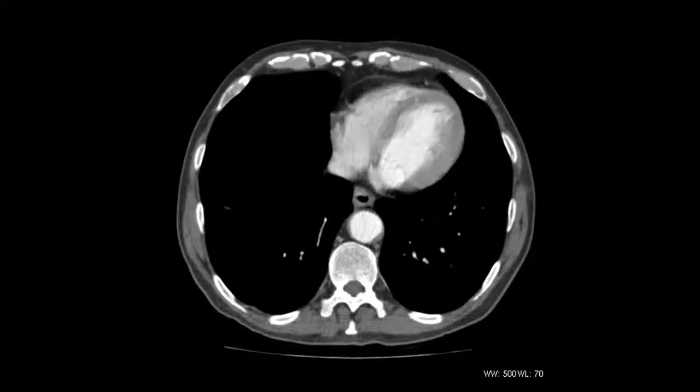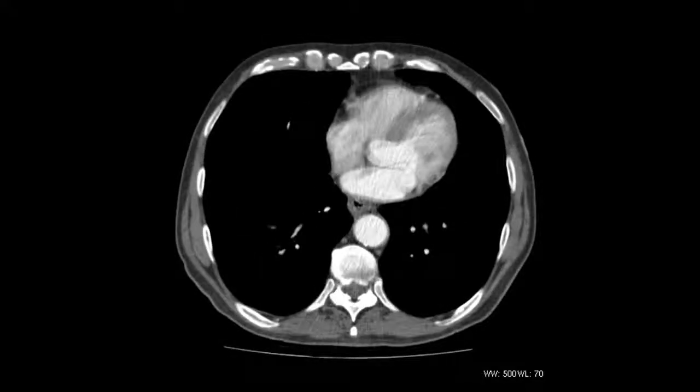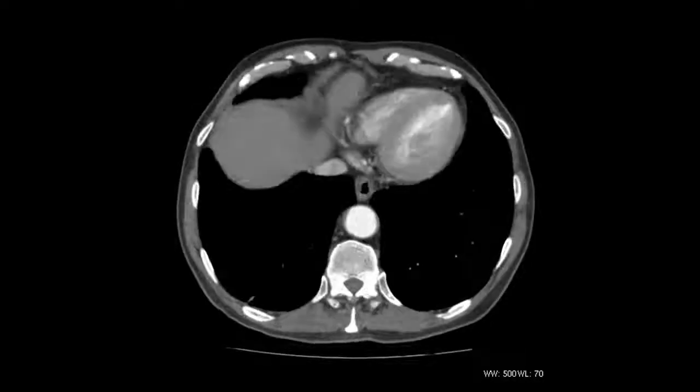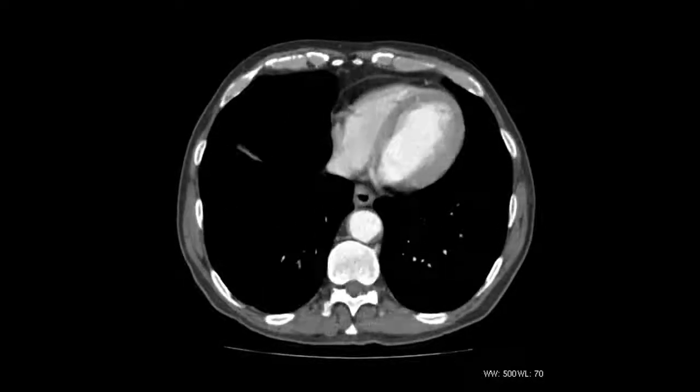So when I first get a CT through, exactly what you do depends a bit on the indication, so the clinical information is crucial. But in order not to miss anything, I tend to go through in a certain order. So to start with, I'll look at the lung bases.